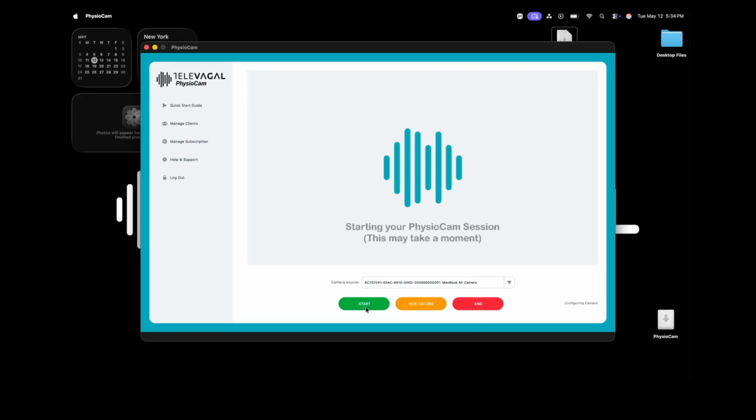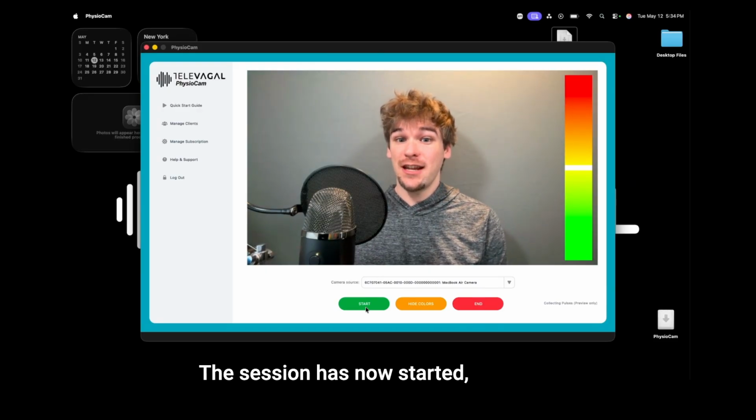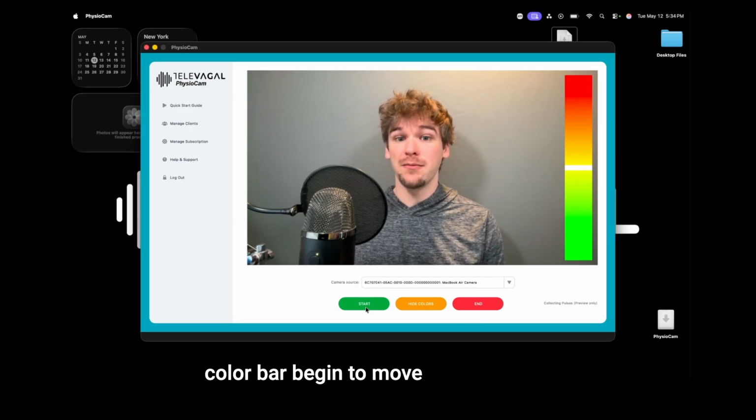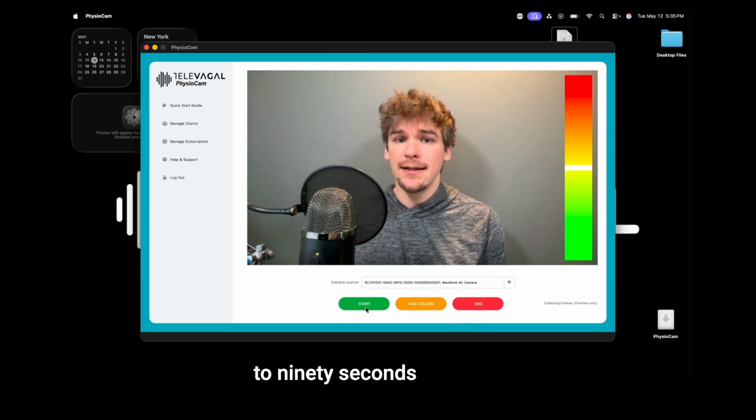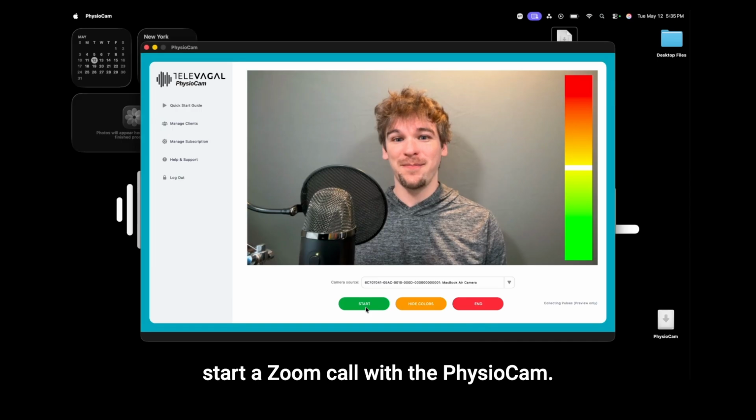Hello, and welcome to your first PhysioCam session. The session has now started, and after a brief calibration phase, you should see the indicator in the middle of your color bar begin to move up and down. This could take about 60 to 90 seconds to begin, so while we wait, let's go ahead and start a Zoom call with the PhysioCam.